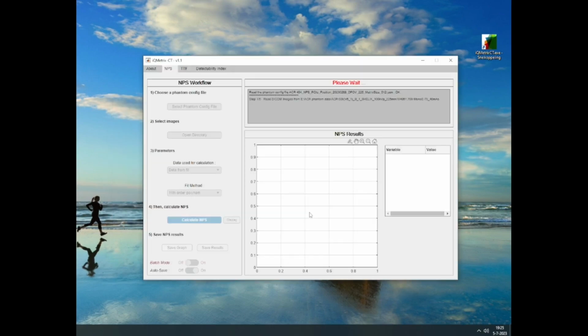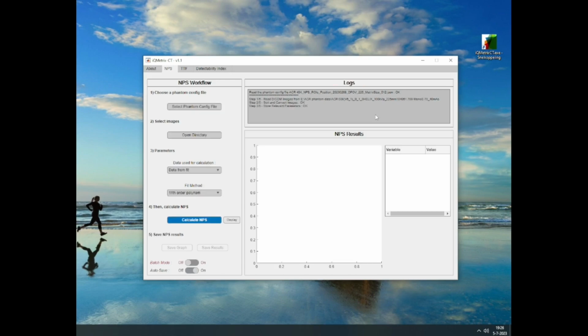Alright, start by clicking that file. Alright, so wait a little bit till it runs, till this red part. Please wait till that one is not showing anymore. Then you know that you can start with the next step. This should not take that long. Takes a couple of minutes. And yes, everything okay. This means everything is fine. This means we can start with the next step.